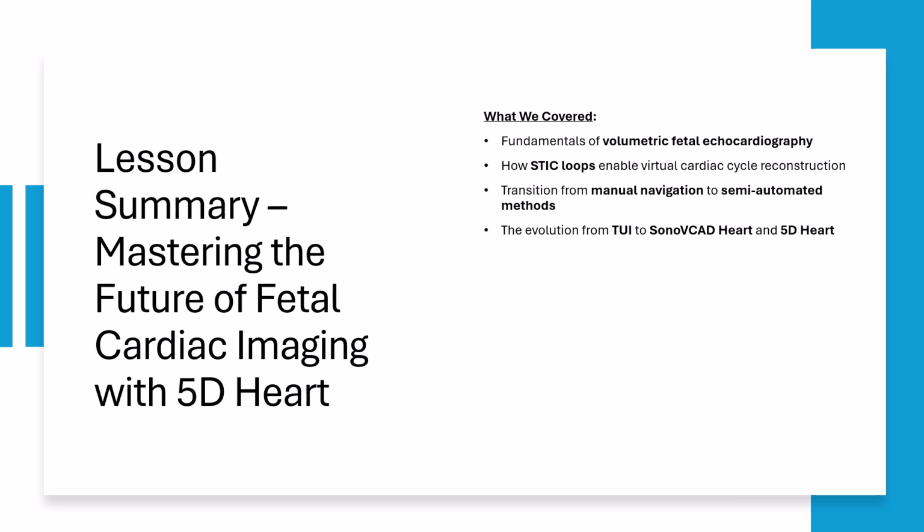We saw how the technology evolved from manual multiplanar displays to tomographic ultrasound imaging, and finally the next gen tools, 5D Heart and Sono-VCAD Heart.